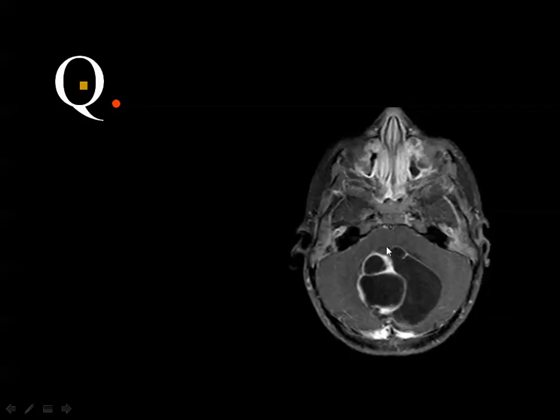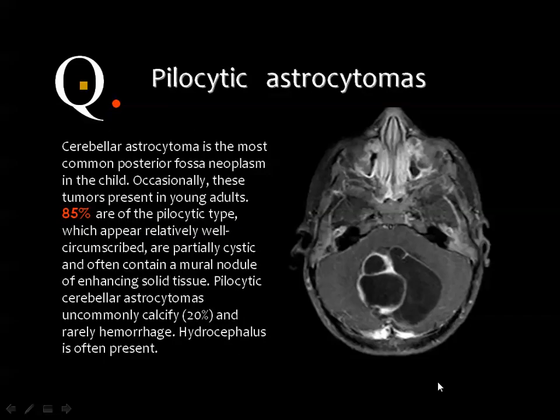And what do you think of this lesion? Glioma? Pilocytic astrocytoma? Wow.